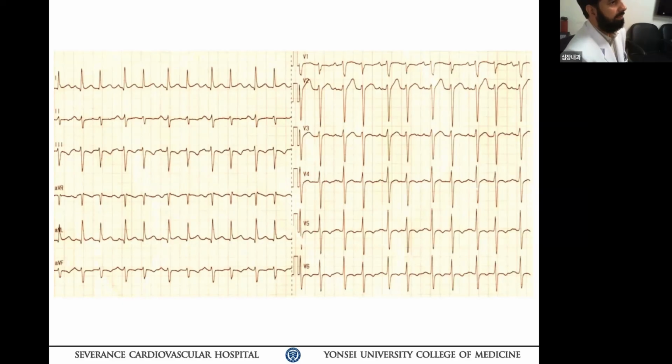But if you look at V2, the T-wave morphology is quite apparently different, right? First and second here. If it is the junctional rhythm, the QRS morphology is a little different from the sinus node, atrial conducted QRS, but usually the T-wave morphology could be similar, but this is quite different.